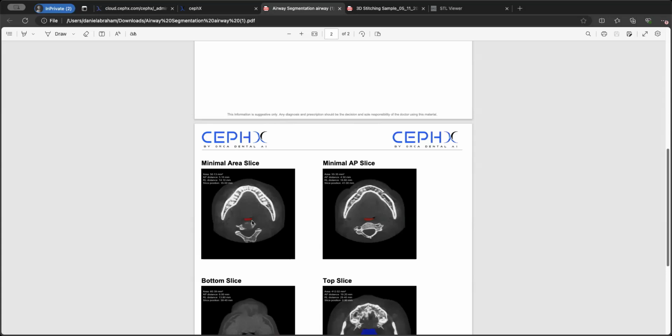It's, of course, much easier to say to a patient, this is your airway, you might want to check it out. And it's not me, the practitioner, it's the computer showing you. So take a look. These things are very, very good for patient communication and case acceptance. They work wonders.